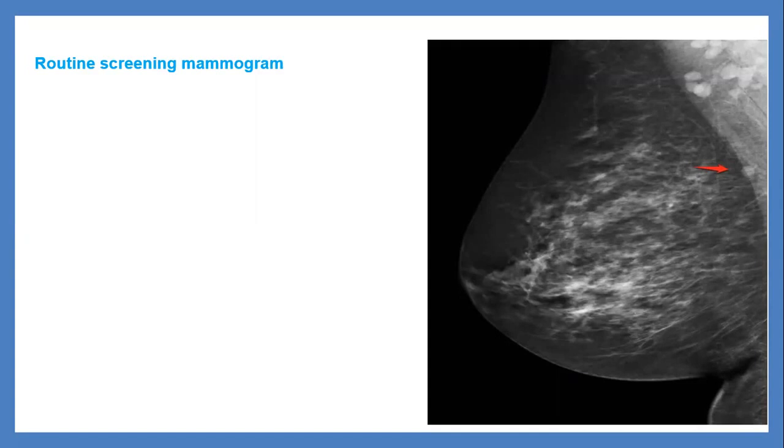When you go to ultrasound, you suspect it to be? I give it BI-RADS 3, this lesion. Yeah, you suspect it as what? BI-RADS 3, but you suspect it as cyst. You suspect it as what? It could be, yes, it could be a cyst. Because high density. Differential by location. By location, it could be.